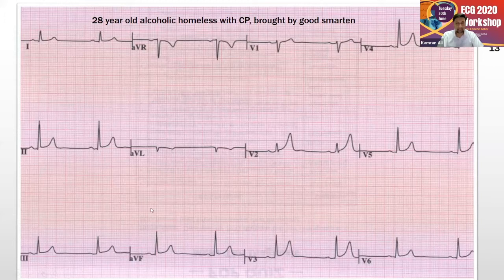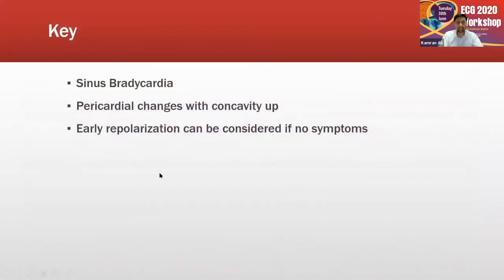There is bradycardia, and it's a narrow QRS complex, but these STs, as you can see, all over, both in lateral leads 1, V5, V6, anterior V2, V3, V4, and inferior also, 2, 3, aVF, are concave upward with PR depression. These are the things, especially the PR depression that you can see in lead 2, that are hallmarks of pericarditis in a gentleman like that.